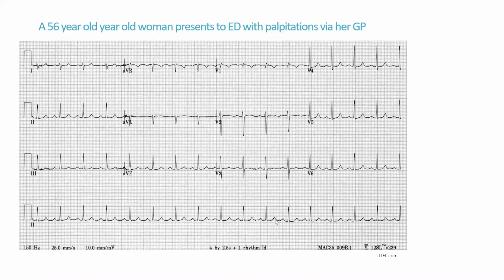And it's because it's starting to encroach the P and the T wave here. You can see the P wave slightly smaller than the T. Those two do look like there's no isoelectric baseline, so I do forgive you for thinking that. But if you look elsewhere, you can see that there is an isoelectric baseline here. That's the main one. So no, this is normal sinus rhythm.